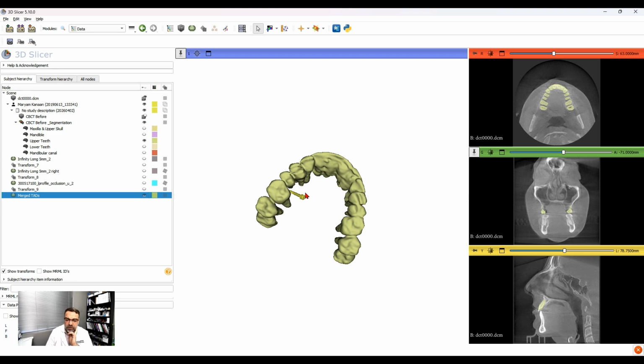And you know why? Because we did not harden it. See? We were supposed to harden that one. The 3D Slicer used the original location. That's why they are superimposed on top of each other. So we're gonna go ahead and delete this one. Delete. Okay. Now we deleted it. Now let's go back. We have one here. We have one there. Okay.